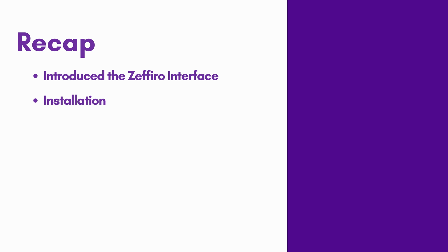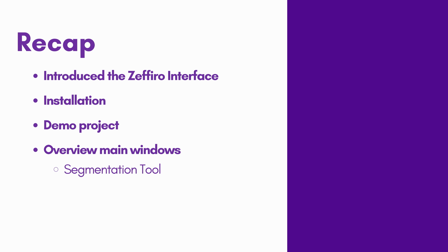In this tutorial, we introduced the Zeffiro Interface software and demonstrated how to install it and load the demo project. We had a glance at the main windows within the software, covering the segmentation tool, mesh visualization tool, and figure tool.